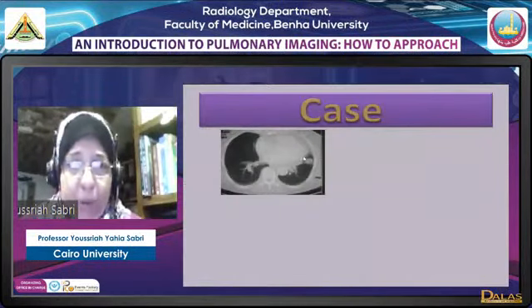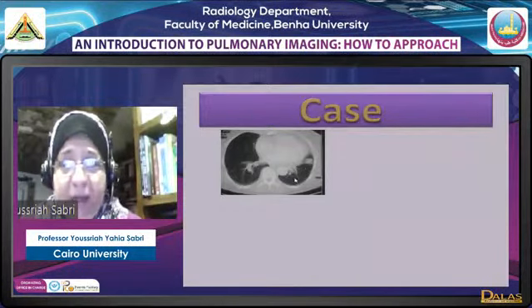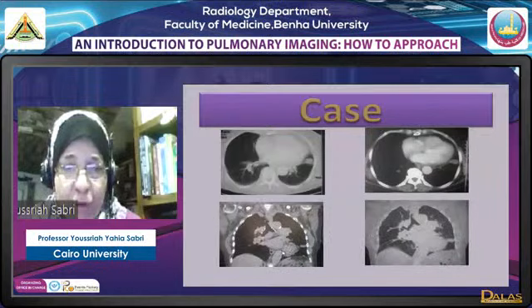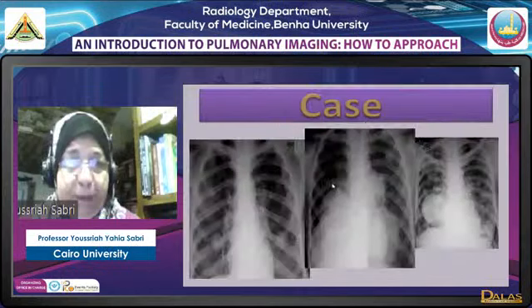Again, a case showing a nodule in the lower part of the left lung. Tissue characterization, mediastinal image shows fluid density, multiplanar imaging shows that this is the site of the fissure and this is only fluid in the coronal image. Again, tissue characterization, multiplanar images.